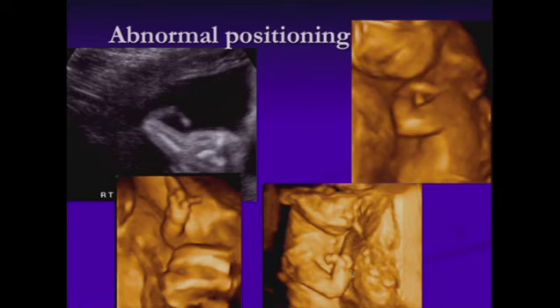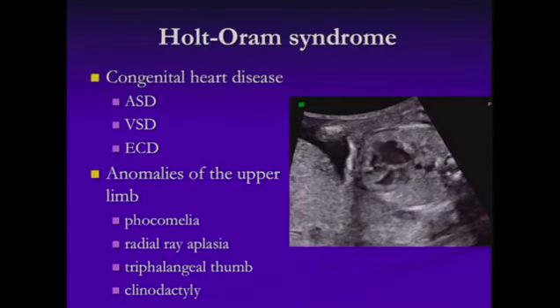This is a very unusual position, and it should really make you think of a syndrome and not just one of these amniotic band syndromes. It's not just a reduction defect. This is something more than that. This is both a reduction defect and abnormal positioning, and the thing to think about there is Holt-Oram syndrome.